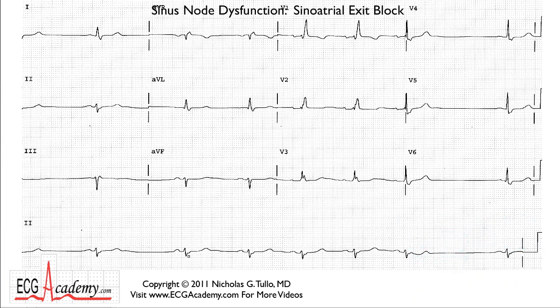Right? There is usually a marked sinus arrhythmia. Here, if you examine this electrocardiogram, you'll see that looking at the forest, there's a tremendous variation in the heart rate. You've got very slow heart rates on this side, then it seems to regulate itself, and then you have a pause here. If you look at the P waves, you can see they're upright in 1 and AVF, and that's fine. So they are sinus P waves. Here you've got very slow beats on the left-hand side, rates in the 30s basically, and then it looks like the sinus nodal rate picks up a bit.